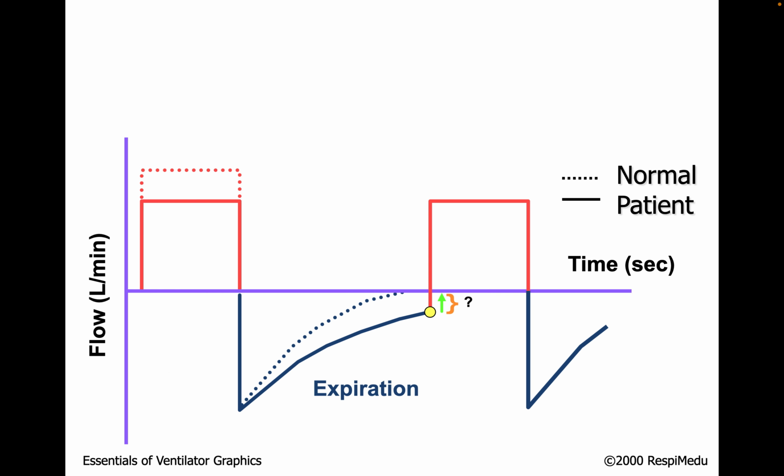Now in this particular scalar, as you could see, the expiratory limb is not touching the baseline, as it should. If this appears on the screen of a ventilator, this is a case of air trapping or auto PEEP generation, and this is classically seen in exacerbation of COPD or asthma. So this is a classical air trapping flow time scalar.